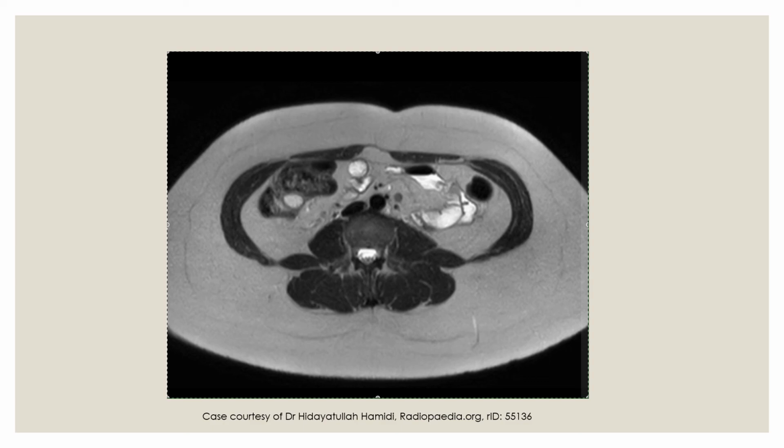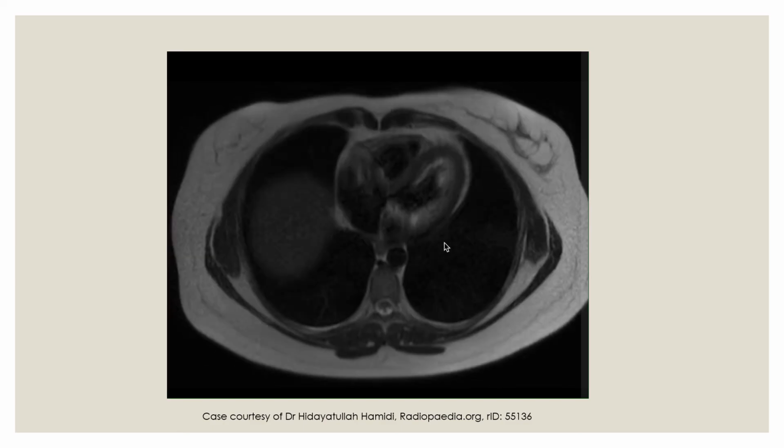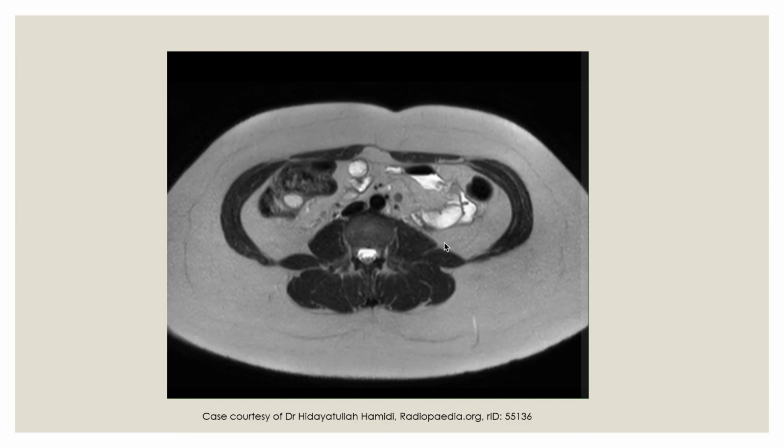T2 is just how we've obtained the images. So on T2 we can see that there are bright things. So fluid in the CSF is bright, as you can see here. We can also see subcutaneous fat, which is bright, and intraabdominal fat, which is also bright. Darker things include muscle. This is the paraspinal muscles, and the liver is also relatively dark, as you can see. So our liver is here.